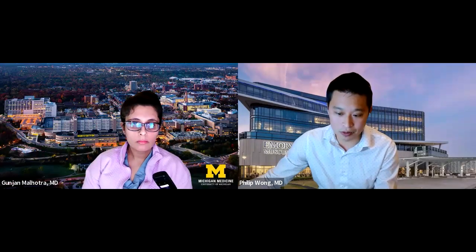There is actually an injury reporting system, the NS-RADS, from Dr. Chhabra's team at Southwestern, and they use something similar to Sunderland. In the setting of a nerve injury, I will use Sunderland. If it's a nerve mass, not an injury to the nerve, I won't use the Sunderland grading system.